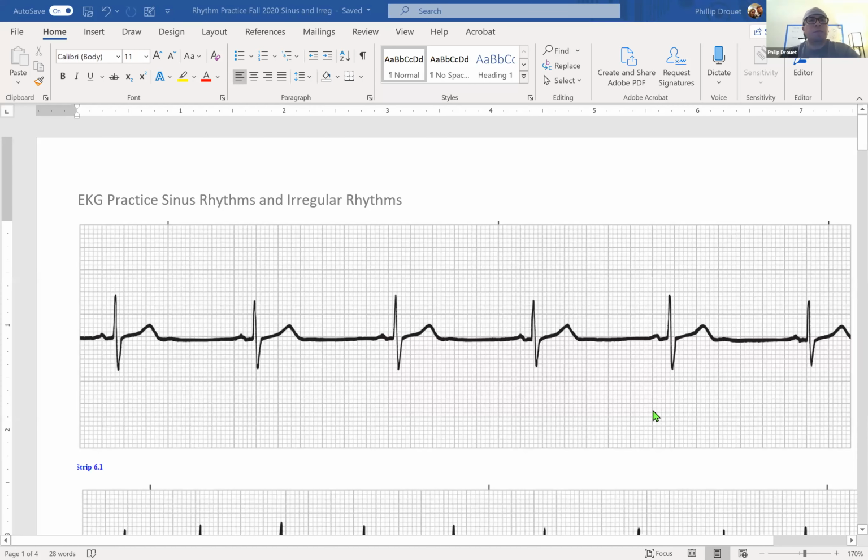Okay, so you will have seen and hopefully remember that we have broken down analyzing EKGs into a step format. So always start with step number 1. Make sure that you are checking for regularity. I'll take my little annotation tool and we'll come across here, so just follow along with me.